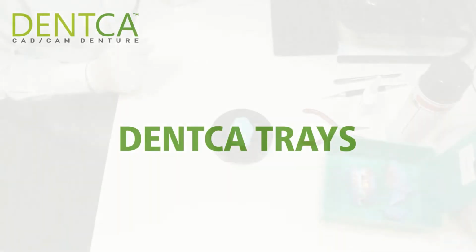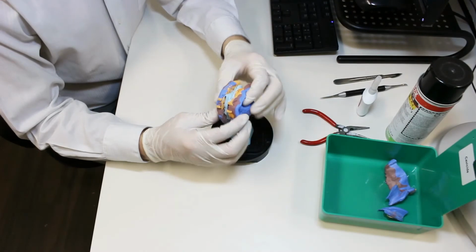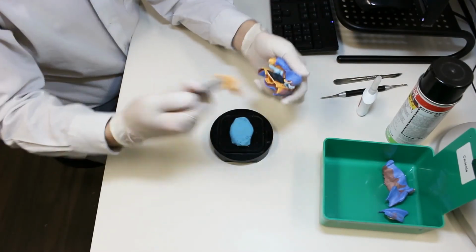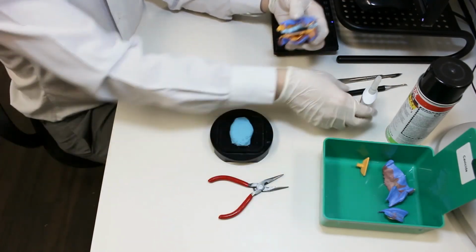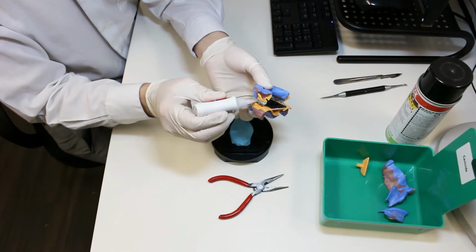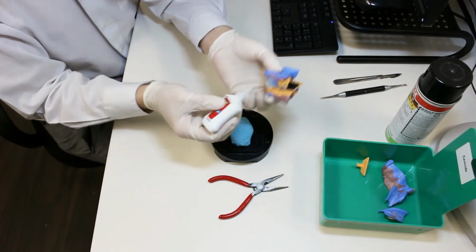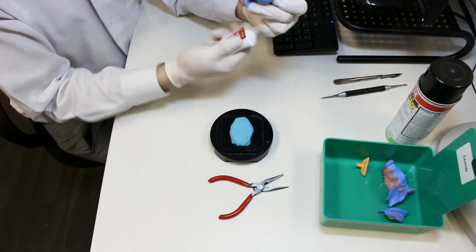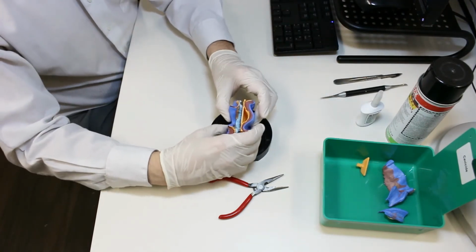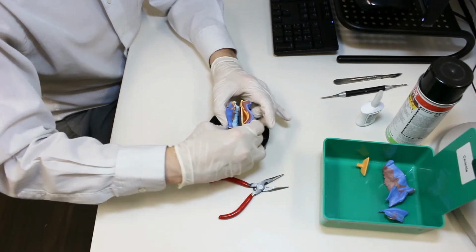For complete cases with DENTCA trays, please remove the lower pin from the bite. Glue the bite to the trays utilizing super glue and ensure that none of the trays are separating or moving. Otherwise they might fall during scanning. And place the trays facing up at 90 degrees.